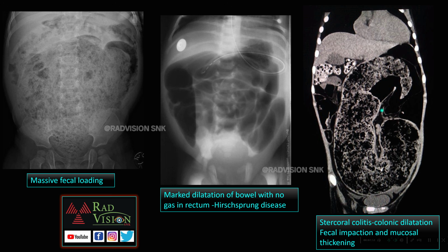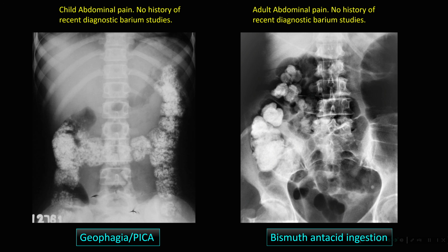Here this is also an adult where you can see the colon is significantly dilated, filled with fecal matter, and also there is diffuse mucosal thickening, mucosal irregularity, and sometimes you can also see mucosal fat stranding and adjacent fat stranding. So whenever there is colonic dilatation with fecal impaction, mucosal thickening and even pericolonic fat stranding, definitely suspect stercoral colitis. And in these cases most of the times the rectum will be empty. So these are the different varied appearances of colonic dilatation with fecal impaction.